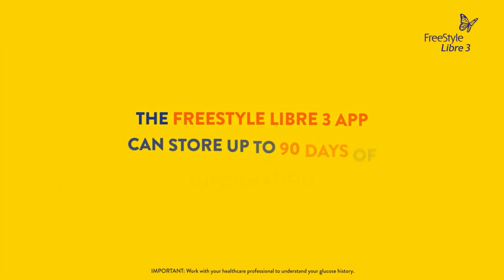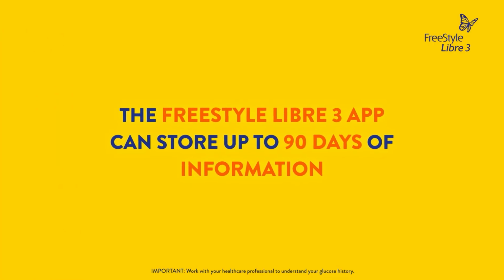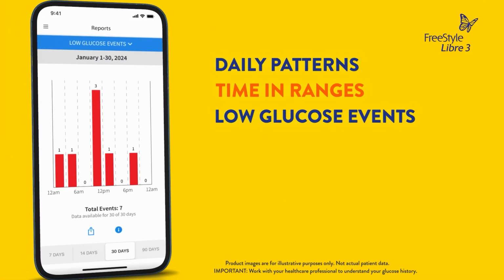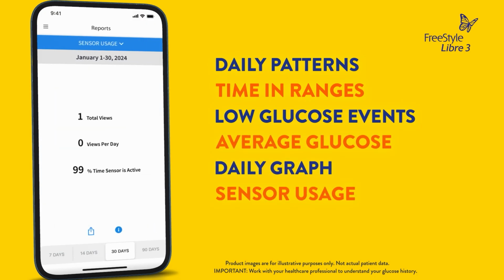The FreeStyle Libre 3 app can store up to 90 days of information and includes detailed glucose reports such as daily patterns, time in ranges, low glucose events, average glucose, a daily graph, and sensor usage.